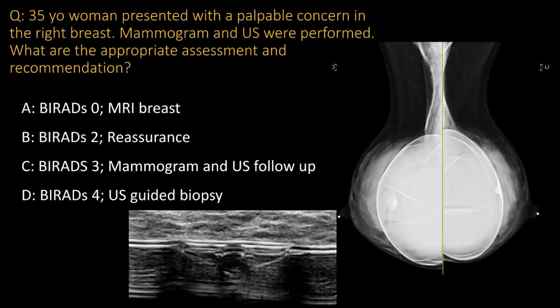Another question. A 35-year-old woman presented with a palpable concern in the right breast. I gave you the mammogram and ultrasound. What are the appropriate assessment and recommendation for this patient? Let's see your answer over here. Okay, you all got it right. This is so wonderful. Let's review it together.